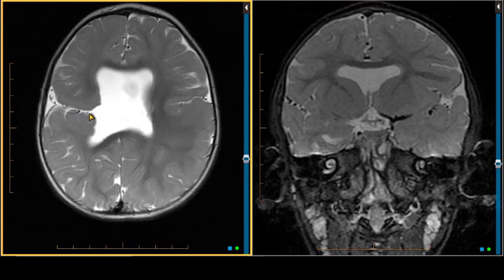Now, a closed lip schizencephaly is where the gray matter margins are up upon one another, and an open lip is where they're widely apart. Now, from my perspective, it's parsing terms to debate whether this is open-lipped or closed-lip schizencephaly, because either way, the parenchymal defect is relatively small, and so we're missing a small amount of brain. So whether you call this a closed-lip schizencephaly or a very narrow open-lip schizencephaly likely has no clinical differentiating features. The issue is that there's not a large gap where there's brain parenchyma missing. So this is a patient with septo-optic dysplasia and a closed lip versus a narrow open lip schizencephalic cleft.